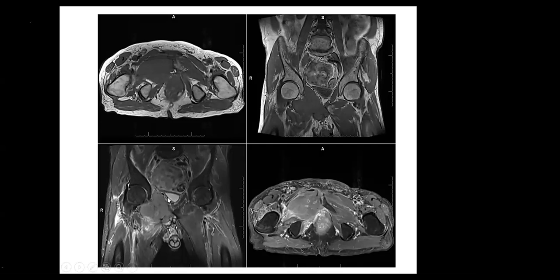There's only two pathologies that actually can give you an aggressive lytic bony lesion with a large extraosseous mass like this one. What are the two, if I may ask you the question, in an adult with a flat bone tumor, aggressive with large extraosseous mass, what are the two tumors that would normally cause this pathology? Multiple myeloma and RCC metastasis.